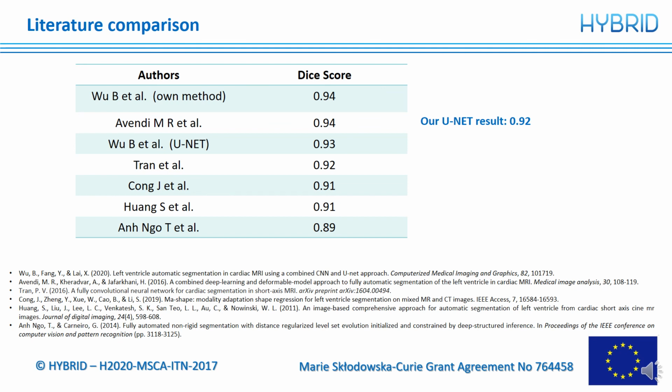So we can say that at this basic level we achieve a good accuracy, a good dice score, and that is one of the main points of this U-Net. And most of all, these open projects allow us to implement it on our own dataset too.